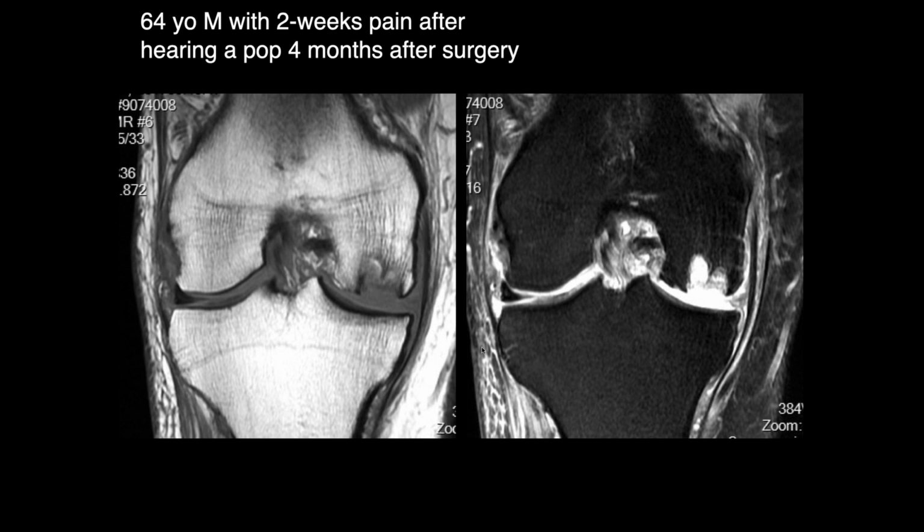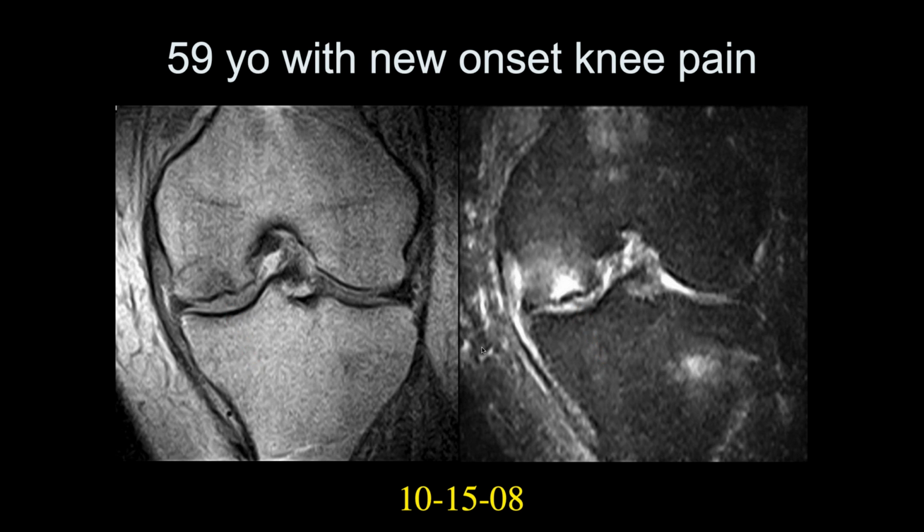So what would you tell the patient on that last case, this 59-year-old? Well, if they've already progressed to this state, I think you still see that the bone marrow edema is there, so there's risk for further collapse. And so I would still keep them non-weight bearing, and try to see if there's some resolution of the bone marrow edema and see how it heals.